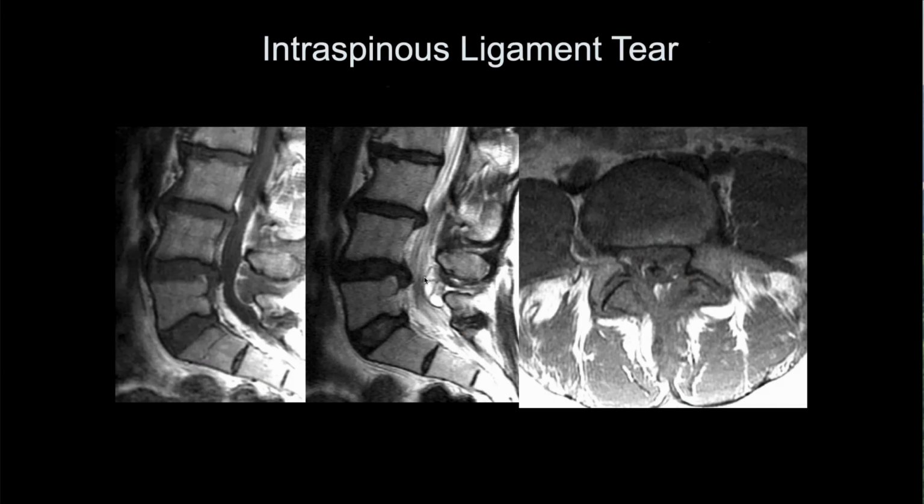And then here are these degenerative cysts that can come out of degenerative injuries to the interspinous ligament, and they can produce mass effect upon the cauda equina. They're typically in degenerated spines, so it's not uncommon to have a degenerative disc protrusion associated with them, but together they can cause significant central stenosis.